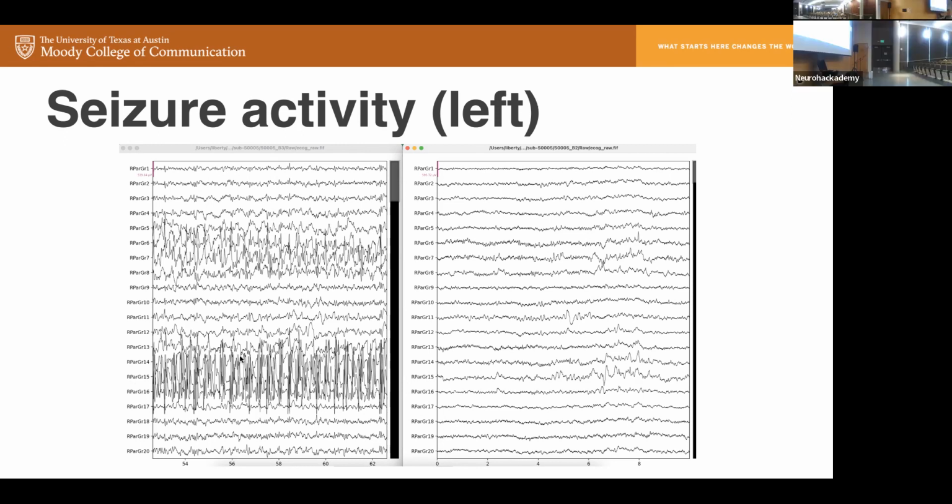Now, what I would do in this case, actually, this person did have a seizure during a task. And so we stopped the task in the middle and we marked that. We are not using this data for our task analysis. Number one, because we had to stop the task in the middle, but also number two, all of this epileptiform artifact means that this person is not going to be processing those sounds in the same way as they would while they're not having a seizure.